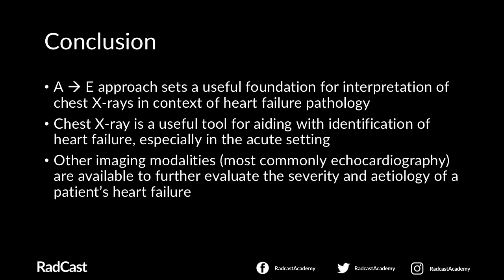Also, the chest x-ray is a useful tool for aiding with the identification of heart failure, especially in the acute setting, due to its relatively rapid acquisition compared to other imaging investigations. This goes back to the point I made closer to the start of the talk, where, because the chest x-ray can only provide limited information at a single point in time, it is best used to aid diagnosis, but you'd have to team this, of course, with clinical history and examination.